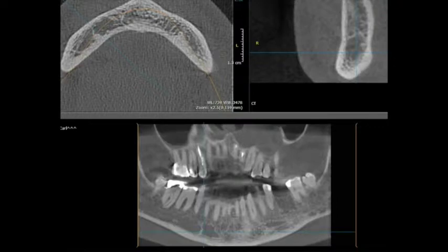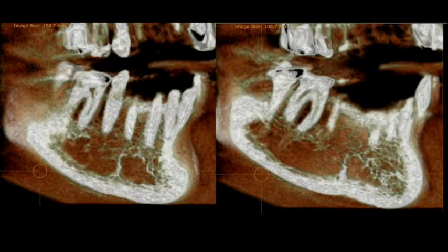But there's no way I would, as a dentist, go digging in there unless the patient had a complaint. Never make the treatment worse than the disease, okay? I even did it in color. This is more anterior, this is more posterior. This was the area of concern, and I went, well, look at the marrow pattern here. Bone has marrow in it.